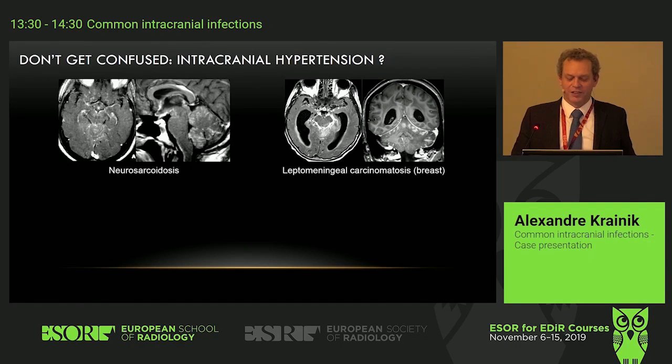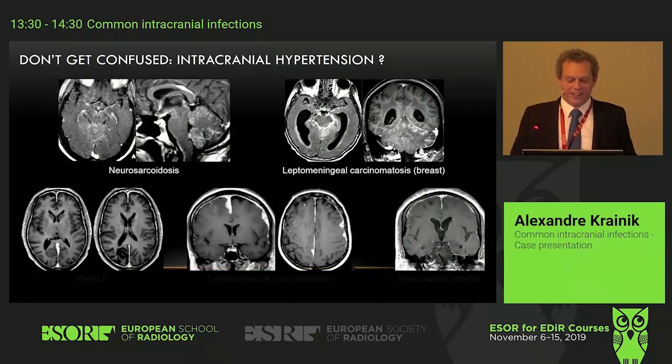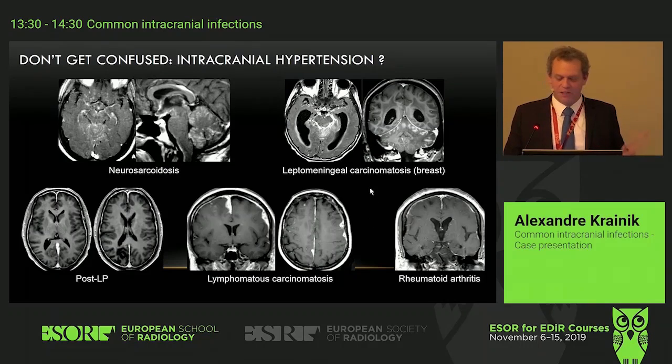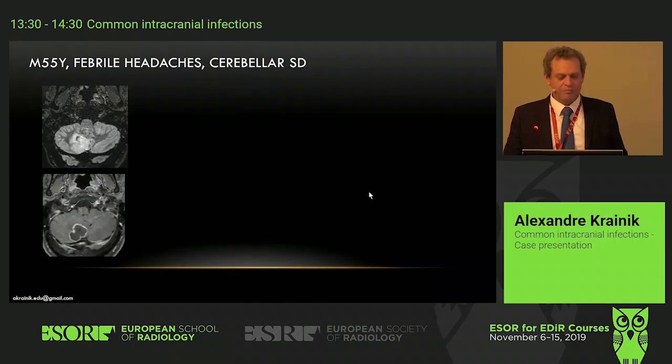Oh, sorry. It was the same picture as before. Just remember, we had this. We've used this before. That of course it's not because you see a leptomeningeal or pachymeningeal enhancement that it's specific of infection. Okay, then let's go.